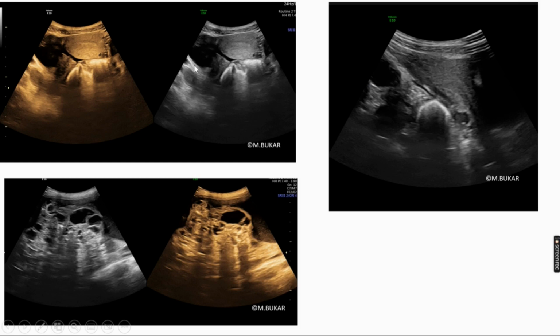These are transabdominal images of the same patient. Here you can see this lesion with extensive shadowing. The surgeon cannot make out what is around this area. Note that the uterus is pushed up and it's just underneath the peritoneum here. Here one can see the uterus, and again you can see a clear demarcation between the cyst and the uterus, suggesting that there are no adhesions. The surgeon was again informed about this, and there were no adhesions at surgery.